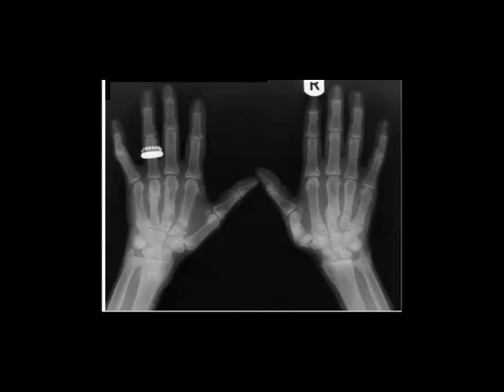So for example, start: is it a skeletally mature patient or not? You can mention that this is a radiograph of both hands, skeletal mature patient. Maybe you can mention the bone density first, then try to comment on the articular and the periarticular and soft tissue, and if there are any fractures. So you have your checklist and try to find it. Okay, I am waiting for any positive answers.